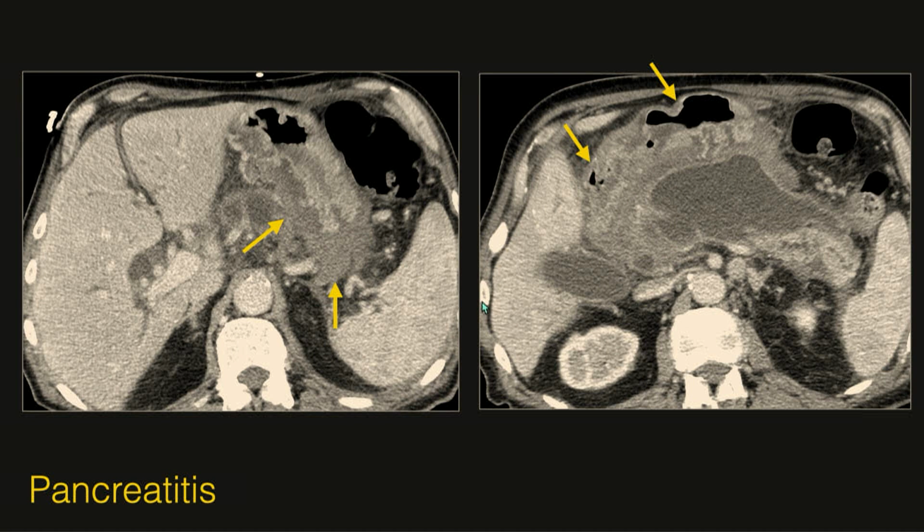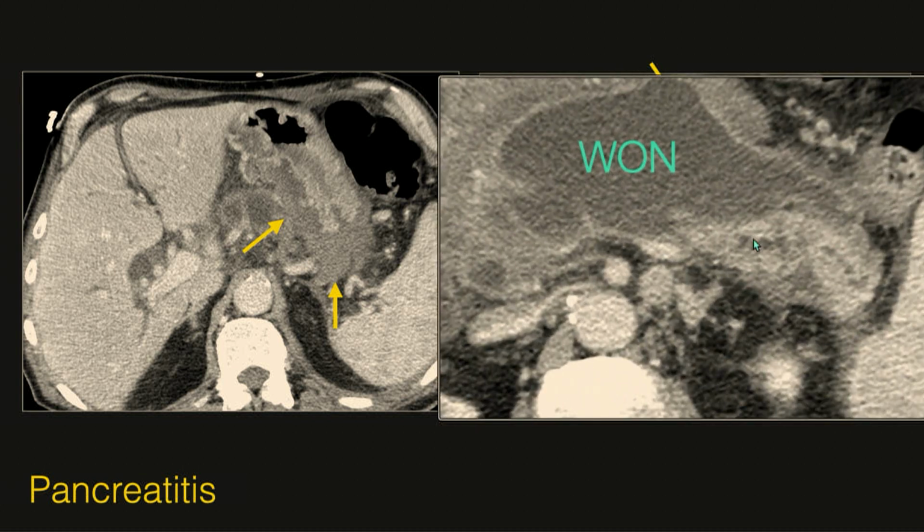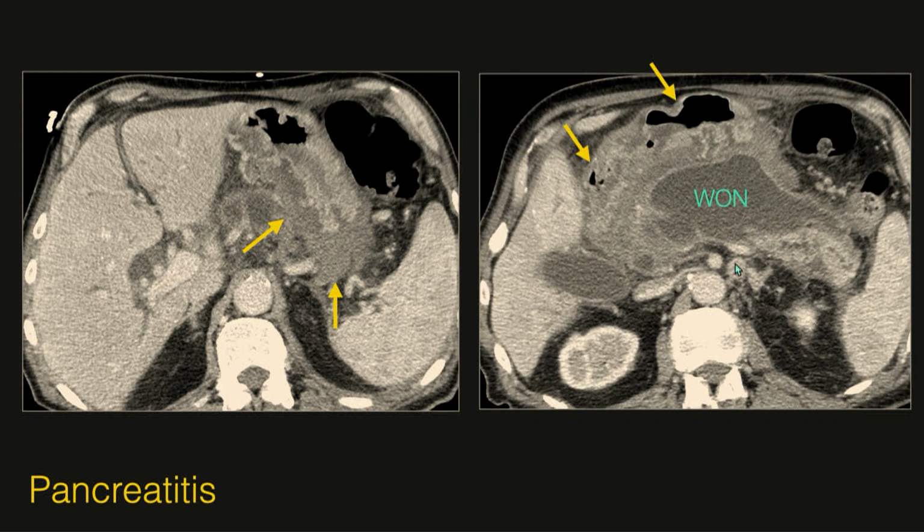This is a more pronounced and alarming appearance of gastric wall thickening related to walled-off necrosis. And the amount of gastric thickening and inflammation in the setting of walled-off necrosis was new for this patient, raised concern of infection, and was treated with cystogastrostomy, and indeed was found to be secondarily infected. Here you can see a little bit of that remaining pancreas tail and dilated duct leading into the walled-off necrosis.